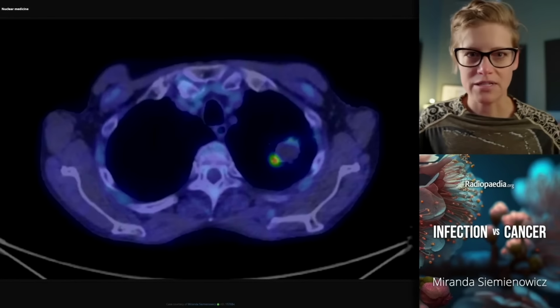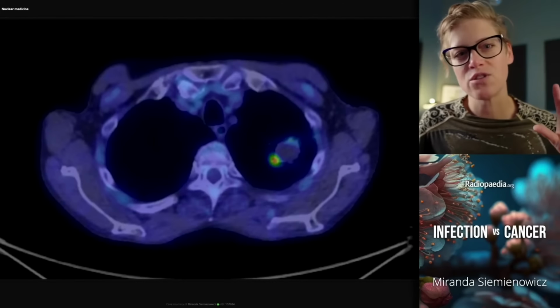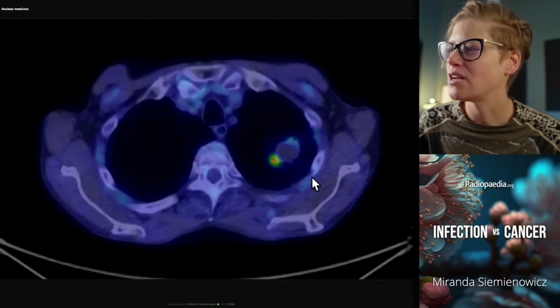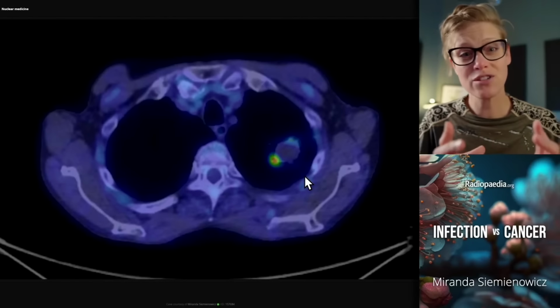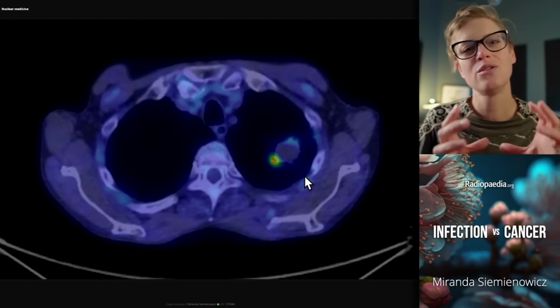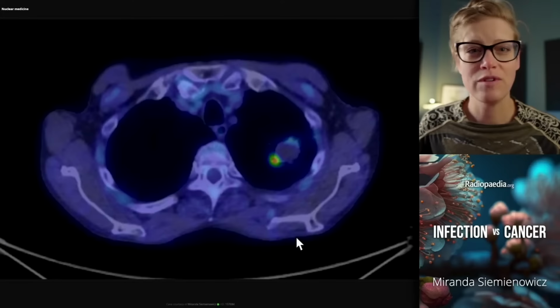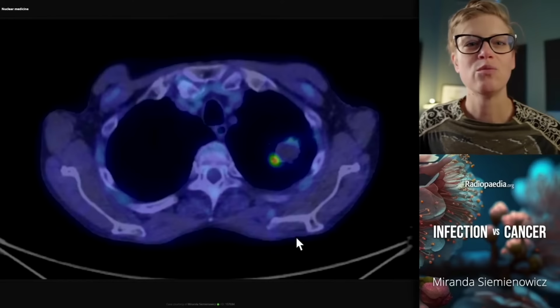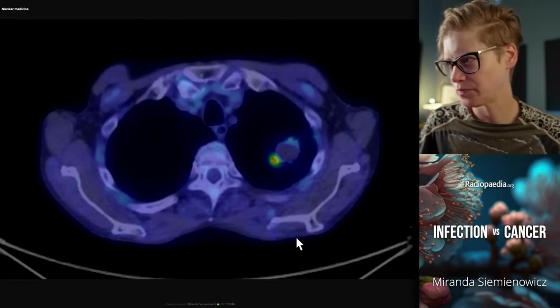What happened here? Somebody got upset, they did a PET. And this is a really great case that shows you the scenario in which an inflammatory lesion is strongly supported by findings on PET. We've seen multiple examples of where it doesn't help. But here we've got a lesion that has absolutely no metabolic activity within its interior because it's comprised of mucus, no living cells, within an abnormal airspace, a cavity, and a little bit of peripheral inflammatory activity at the margin, which is fine. PET appearances supporting what we knew from the morphological features to be a diagnosis of inflammatory mucocele.